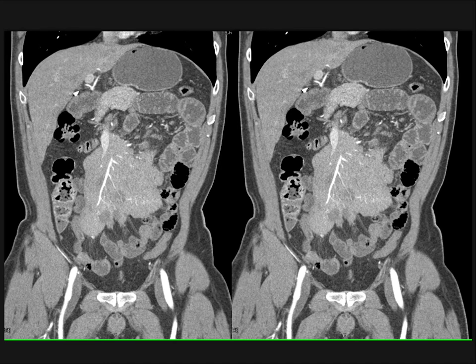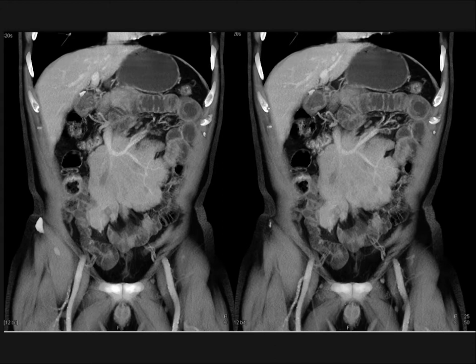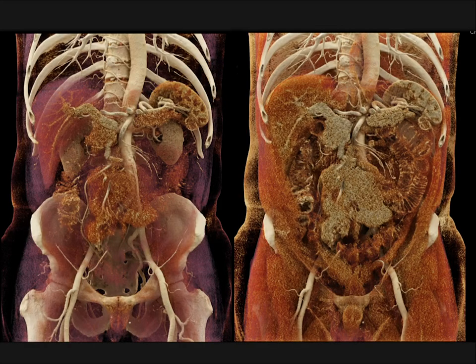And interestingly, there's no substantial bowel obstruction. A few loops may be minimally prominent, but I think sometimes you have processes like lymphoma, and what happens is things infiltrate around the vessels, things infiltrate in the mesentery, but things push. And lymphoma is a great pusher. Though I showed you a large ulcerating lymphoma with obstruction, but look how big that mass was. Here, this is pretty impressive as well, but you can see the infiltration into the root of the mesentery, and the bowel is just beginning to get dilated. Eventually, you can get obstruction, but early on, you may not.